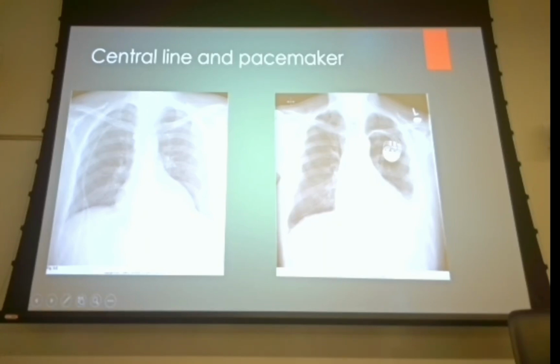I have seen docs leave that central line, particularly the hard stick, going up instead of going down. Is that a problem? Is this something we ought to report to the Texas Medical Board, and go to war with a doctor over this? Is it bad that it's going up instead of down? It's ugly, right? But what vessel is that in? Is it in the subclavian artery? Or is it in a subclavian vein? It's a vein.